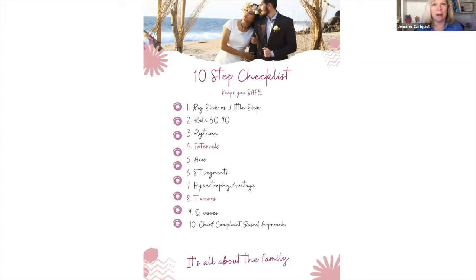By the way, there's a great free app you can get called crediblemeds.org that will help you find all of those medications that cause problems. Step number 5 is the axis that's included in the intervals, and that's only really helpful if you're dealing with a wide complex tachycardia.